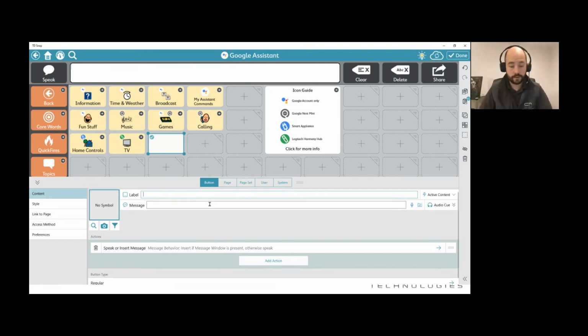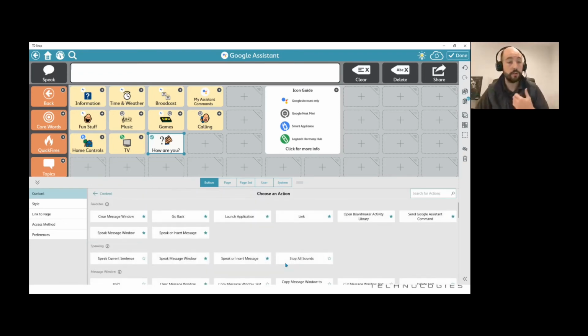Okay. And you can say, for example, how are you? If you're just asking Google how she is today, you just type in how are you as your label. Okay. What I'll do then is below you'll see that there's actions. We just need to add that simple action to the device. So the adding of the action is basically your Google command. So we need to search for that Google command.